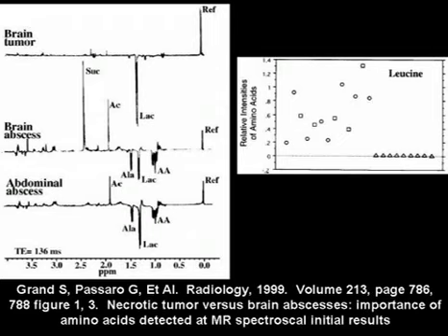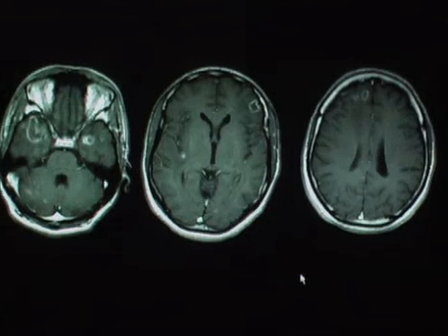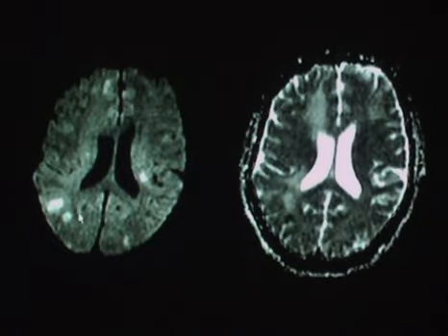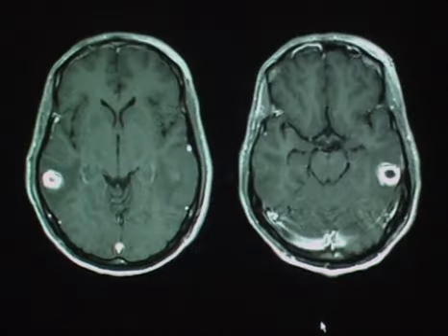million range. And when they went ahead and looked at these lesions, none of the brain tumors had elevation or presence of amino acid peak, while all of the abscesses did. So this is one potential way we can use additional MR modalities to help us out. Even in cases where you have smaller abscesses, as in this patient who had multiple abscesses due to embolic phenomena from endocarditis, you will have some of these lesions also demonstrating some restricted diffusion, as seen here in the diffusion and ADC imaging. Just an example of some cerebral abscesses mimicking cystic metastases.